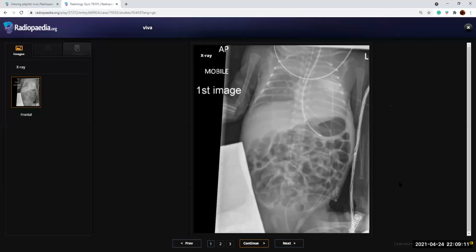Okay, anything that you have commented already, can you club all these findings together? You've actually picked up all the findings. Now you need to club it together and tell me your diagnosis. Basically, I think because of the placement of the endotracheal tube, which is low down, there is some form of right upper lobe collapse. Okay. So what would you suggest to do?